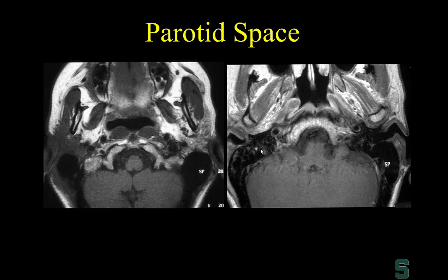Now, the fact of the matter is that 9 times out of 10, the surgeons are going to know whether or not the patients have a malignancy of the parotid gland. Why? Because the facial nerve is already out. So our job is not necessarily to give, again, a litany of a large differential diagnosis. What we need to be able to tell our surgeons is whether or not there's retrograde perineural extension. Because if there's no perineural extension, then the surgeons could potentially just do a total parotidectomy.